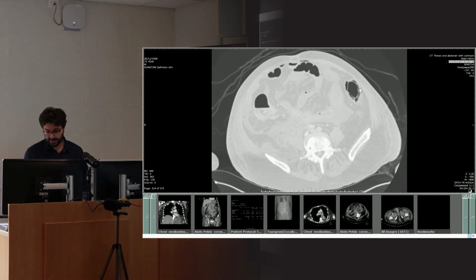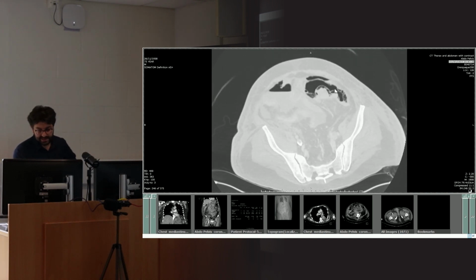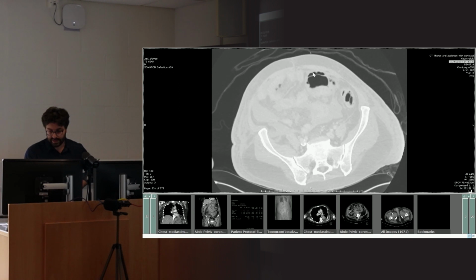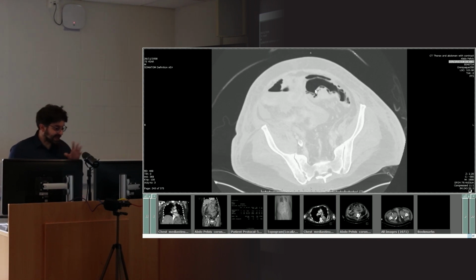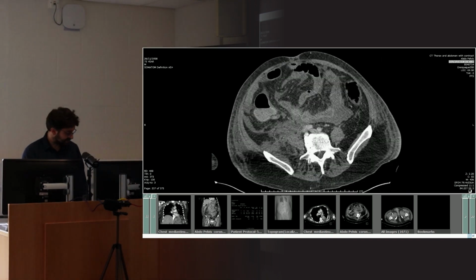Look at the colon. Oh, what do we have here? You can see the mucosa of the colon, and then you can actually see gas inside the wall of the colon. This is pneumatosis. It's gas inside the wall of the colon. Look at that. Gas bubbles all scattered throughout the walls of the colon there. And then here, this is gas perforating through the wall and coming out. So this patient basically infarcted their sigmoid colon just as a complication of pancreatitis. And their colon basically fell apart and perforated.